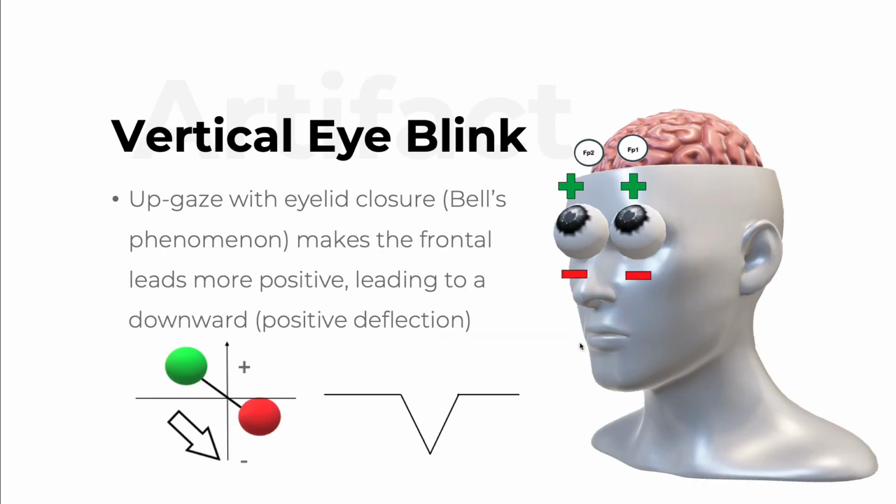This comes into play when you read an EEG because you're seeing the patient's eyes move quite frequently. When a patient closes their eyes, there's something called the Bell's phenomenon, where their eyes actually then tilt upwards. When you have this occur, the cornea is more positively charged, so you introduce a positive charge near to the frontal electrodes. This then causes what we talked about before when you have a more positive first electrode compared to the second, and that is a positive deflection, which is a downward deflection by convention. I'll show you some examples of that.